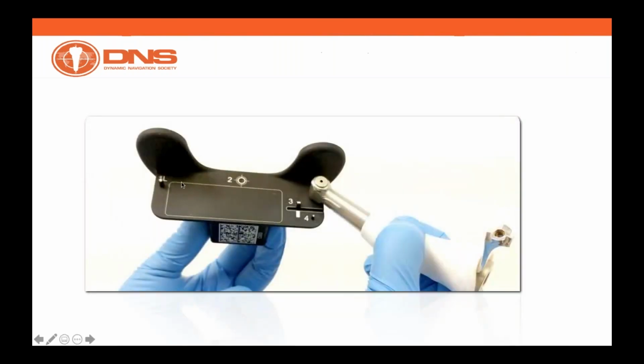And this is the other view of this caliber, the metallic caliber, and it's metallic because we're going to autoclave it, so it's autoclavable and can stay sterile on the mayo table. And you see, besides number 2, number 3, and 4, we also have other numbers, 1L and 1R, which are used, if you are left-handed or right-handed, to calibrate the axis of a contrangle.